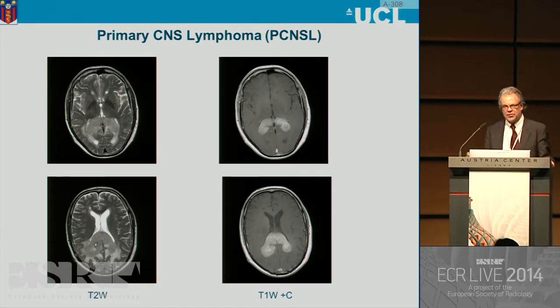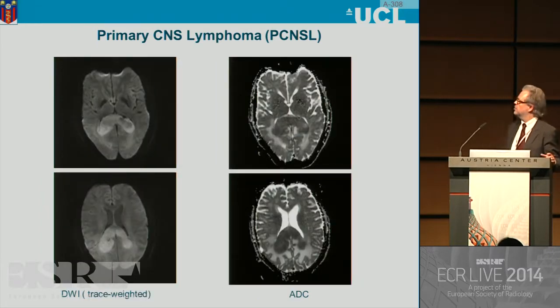But there is generally a decrease of lymphoma in HIV patients because they get treated more, but there's a much bigger increase in the immunocompetent population. So lymphoma is going to be more and more important, and it's really important to know about that for the differential diagnosis. You look at the diffusion-weighted image, the trace image, it's bright, and then it's darker than the brain tissue on the ADC map. What you see here as bright is the surrounding vasogenic edema.